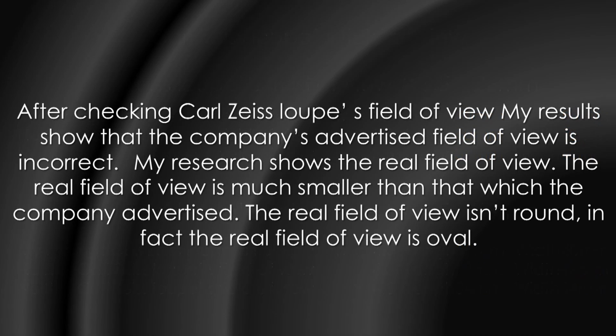After checking the Carl loupe's field of view, my results show that the company's advertised field of view is incorrect. My research shows the real field of view is much smaller than that which the company advertised. The real field of view isn't round. In fact, the real field of view is oval. This is my research.